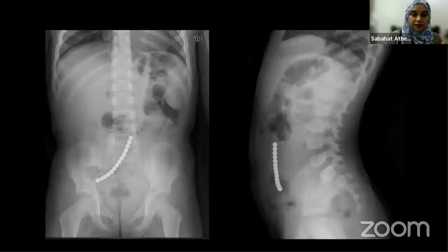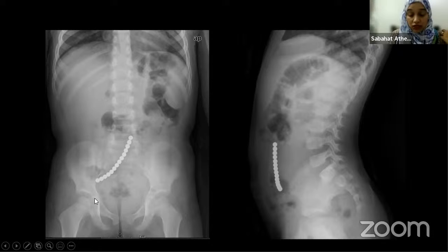Next case. A child. What's happening here? You will inform the pediatric surgeon, okay? This patient, it's not an AVN, I think it's projectional. The finding here is metallic foreign bodies. The child actually ate 14 magnetic beads, 14. And you can see that they are all joined with each other.